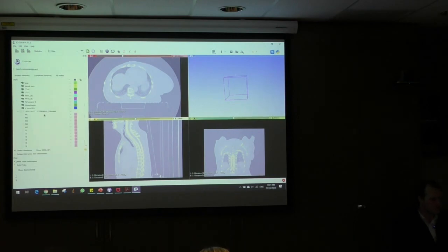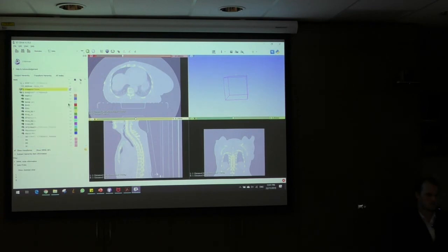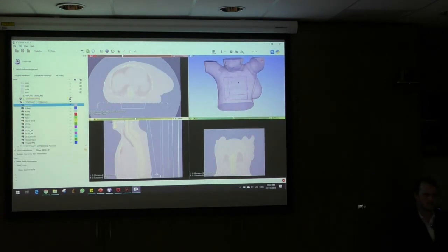We can quickly have a look in the data. So it hasn't come up yet. Usually what will happen is it will generate the 3D model over here in this window of what you've just done. No different to what you've previously seen with these here. So these are all generated previously.